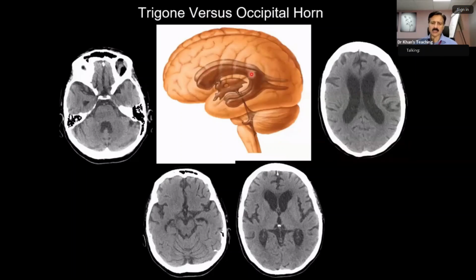Now, this is the lateral ventricle. The lateral ventricle has the frontal horn, body, and the trigone. This is the temporal horn, and this is the occipital horn. Please remember that the trigone is quite a substantial structure in a craniocaudal dimension. So if the slice is going like this, this is the level of the body, and posterior to the body is going to be the trigone. Look here: frontal horn, body, and trigone.